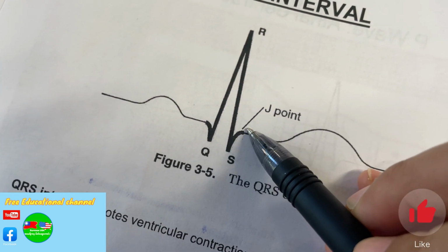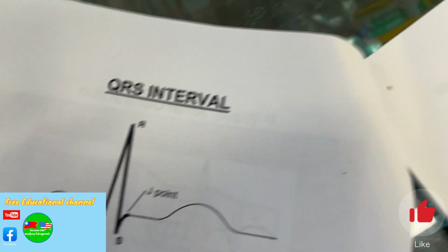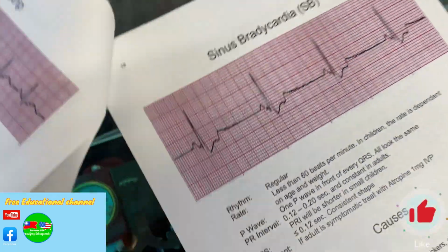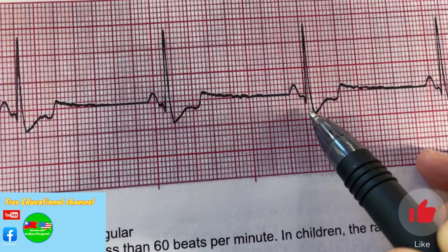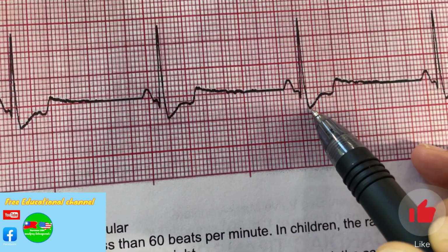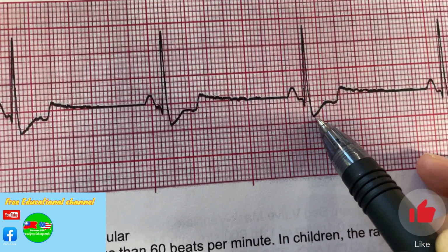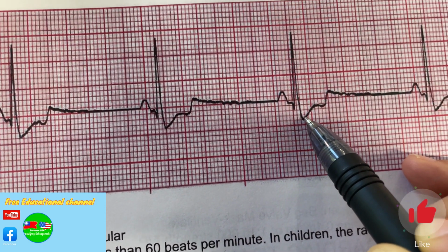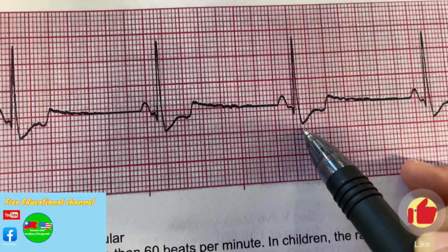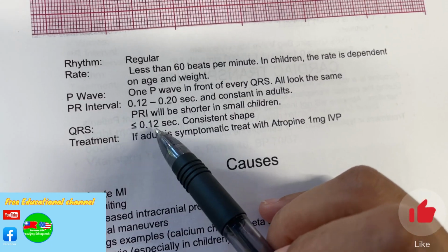It's only here, right here. So we're going to go back. 1, 2, and 3, I would say it ends around here. 1, 2, and 3, about that. It's right here. So that's good, and it's less than 0.12. Okay, good.